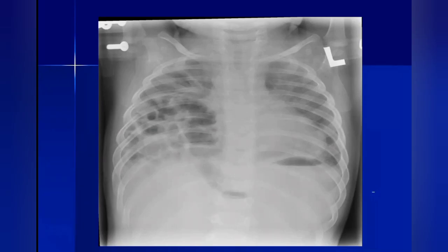Sir, these are cystic lucencies of variable sizes occupying the right lung, and I can see that it is causing some mediastinal shift towards the left side also. I can see a lucency which is traversing from the abdomen towards the right hemidiaphragm, towards the right lung base. In my provisional diagnosis, I would put congenital diaphragmatic hernia causing mediastinal shift. As it is causing mediastinal shift, I will refer it urgently to pediatric surgery.